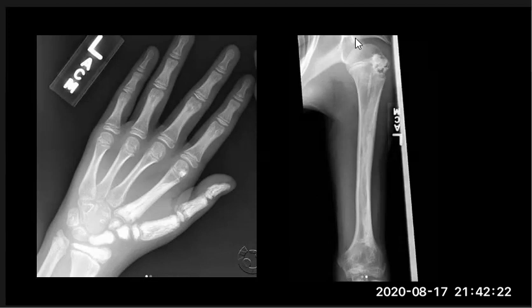This is the glenoid cavity here, and this is the scapula, and these are the distal ribs. In the humerus there is an abnormal lesion at the head of the humerus, destroying the cortex, a mixed lytic and sclerotic lesion.